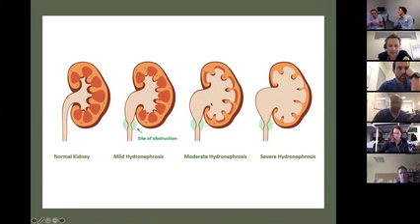All right, but if you come to the moderate level, the papilla starts getting flatter, and we see the pyramids are getting squeezed. But you still maintain your cortical thickness at the moderate level. When it comes to severe, the pyramids have been completely squashed against the cortex. You also get very marked cortical thinning when it comes to severe. All right, so that's the thing.